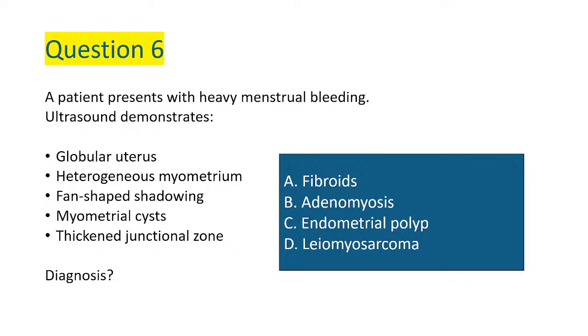Look at that. Leiomyosarcoma. So initially when I saw this, I was thinking that there is sort of a shunting happening between the carotid and the jugular vein, I didn't understand. But when you add color, you can see that. So the globular uterus with the heterogeneous myometrium, what is this, guys?